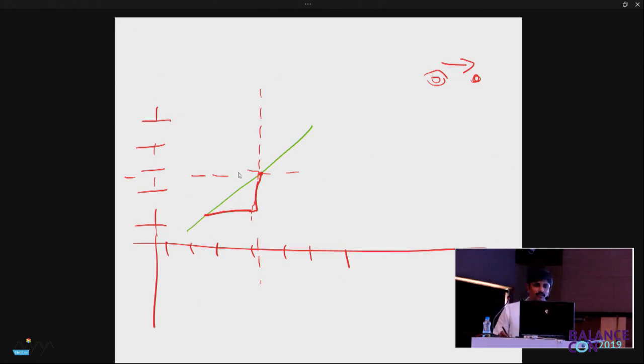Okay. So what happened is, the eye had fallen short of the target, then it makes one jump to reach the target. Again, the target keeps moving, the eye is not capable of slow movement, so the eye just stays where it is. After some time, it realizes the target has gone back, and then it goes up.